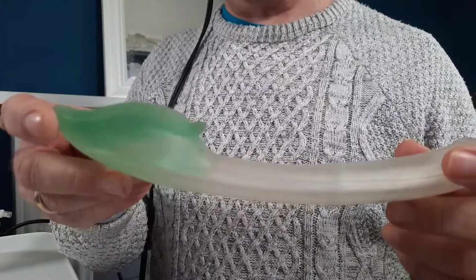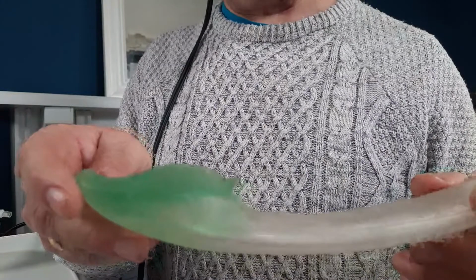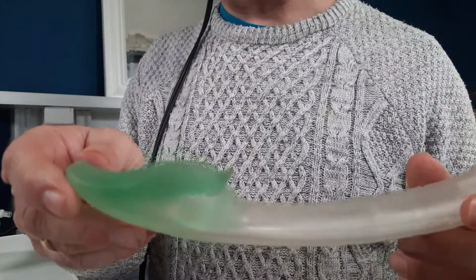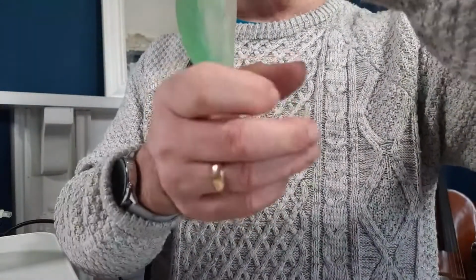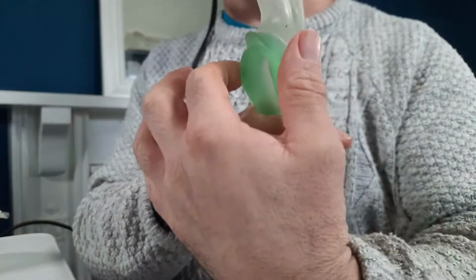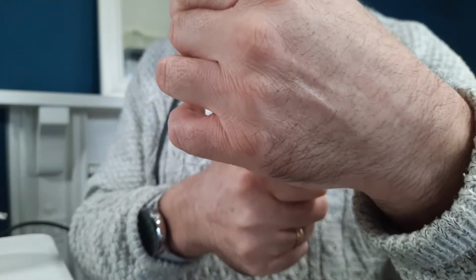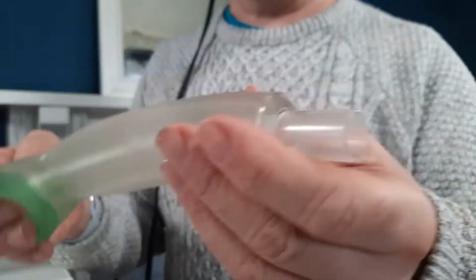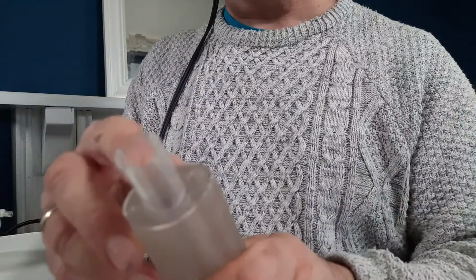And this can rescue you if you can't actually get down the cords. If you can't intubate the patient properly, it may be that we'll resort to an LMA instead. And this doesn't go through the cords, it just sits above the cords and blocks the esophagus. So this is the esophagus, if you like, and the cords would be here at the front. This end is blocking that esophagus, and this is sitting above the cords, and hopefully we'll be able to ventilate the patient using those.